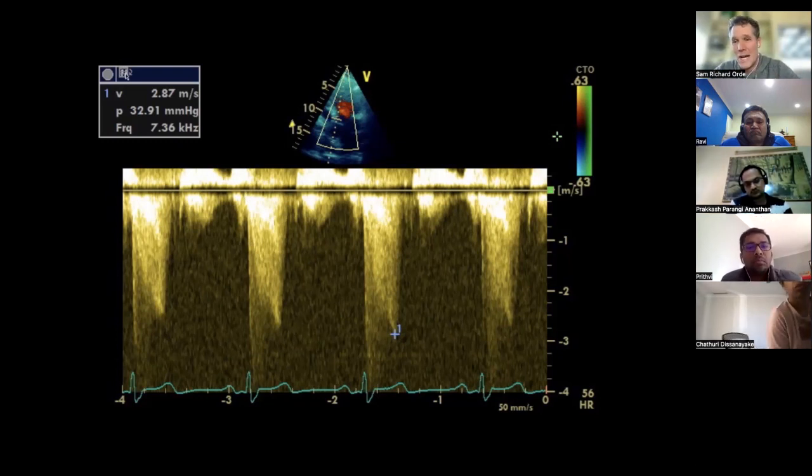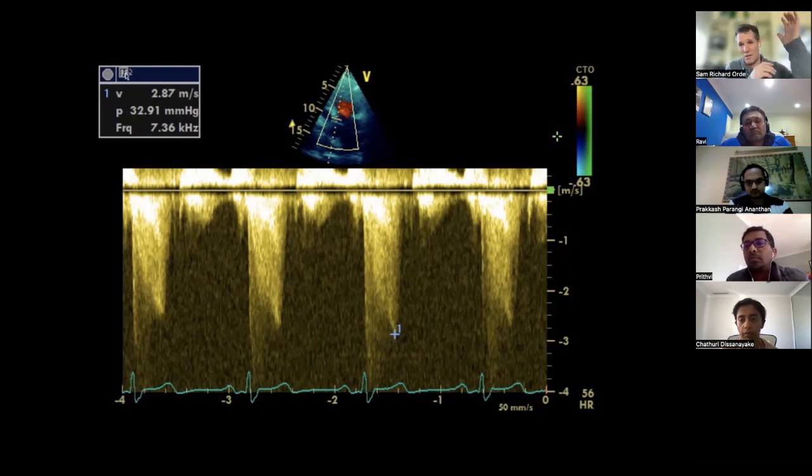So talking about AS is okay, but you've got to give me more, because the normal thing I'm showing you with LVOT obstruction is MR, right? The language has got to be tight in there. This is a slightly curly one, and it could be AS, could be MR, but I had to prompt you a little bit to get to the MR. And normally that's what we see with the LVOT obstruction, MR, right? Because that's where it's pulling it forward.